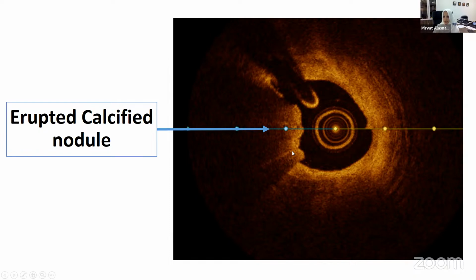And these tend to be less resilient than the other nodules. So they've already gotten some fissures. So these, I would try cutting balloons here if I can deliver them. I would try in these because they're just not too soft, but they are softer than the nodule that we saw that was totally calcified. And remember, again, you want to be doing imaging in between, because where it will tend to fracture is at the edges, where it's junctioned with the normal vessel.